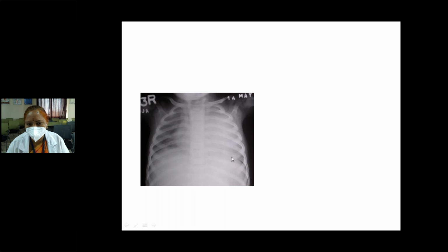It's most probably a case of cardiomegaly. Here also there is a clear angle. Usually in pleural effusion, costophrenic and cardiophrenic angles both will be obliterated. Here you can see small translucency, that means it's not obliterated. So this shows haziness without obliteration of the costophrenic angle. We have to think about cardiomegaly.